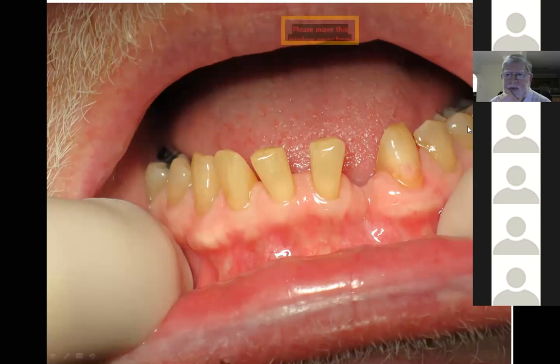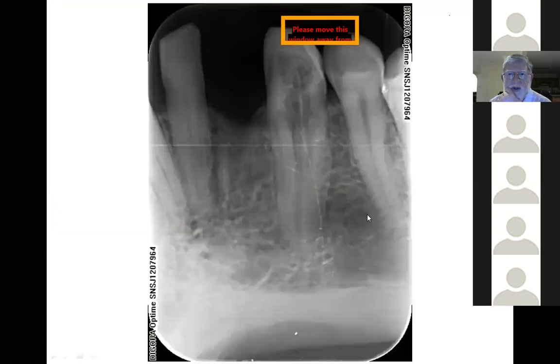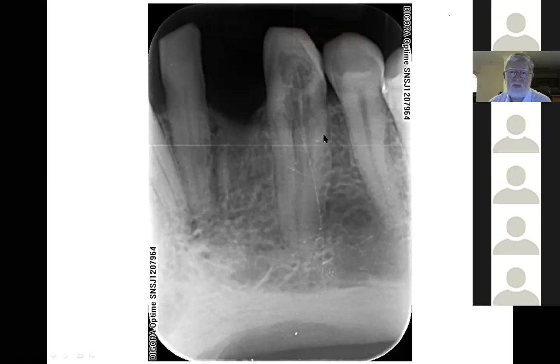Okay, yeah. So the pinkish in the pulp is visible, excellent. So let's go on to the radiograph. There's the pink spot there. And here we are, a fairly aggressive internal resorption of this tooth. You're ending up with a very, very thin shell of tooth extending to a good 3-4 millimeters below the alveolar crestal level, and this tooth was extracted.